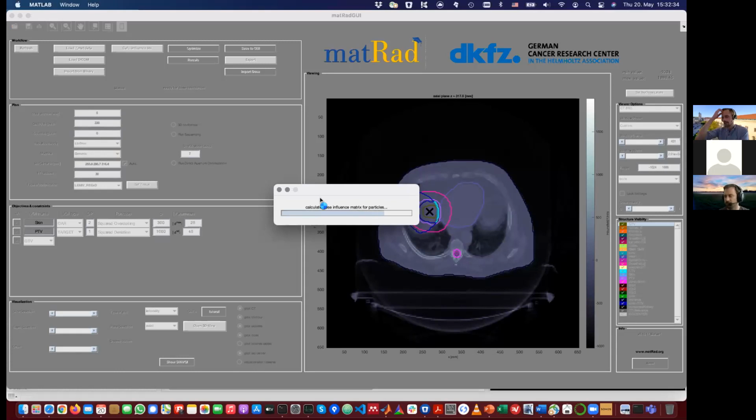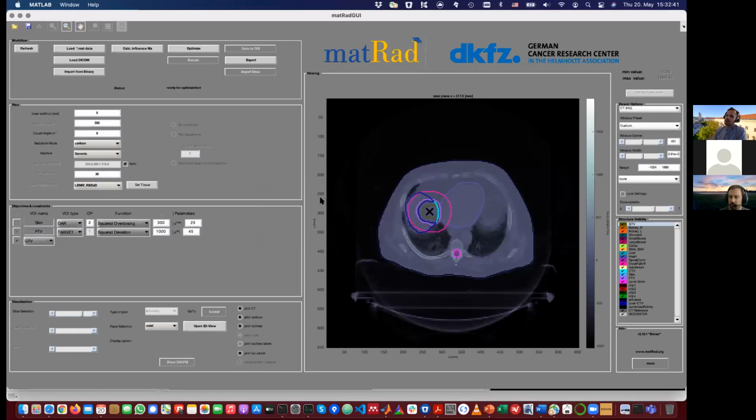For this example, it's important to also keep the previous example in mind. When we changed our tissue alpha-beta ratio from 2 to 10, then we needed to apply a higher physical dose to end up also with a 2 gray RBE weighted dose.